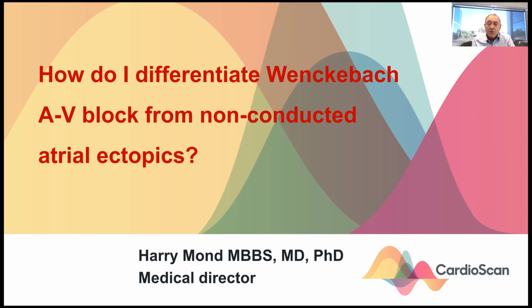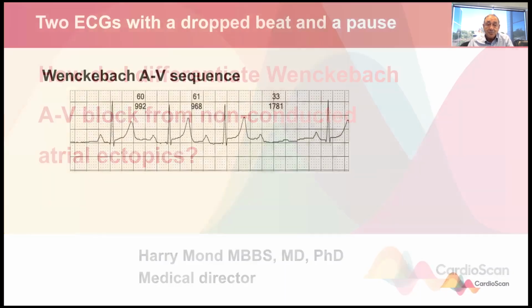So what I'd like to do today is to explain to you the footprints of both Wenckebach AV block and non-conducted atrial ectopics and use those footprints as a means of very rapid differentiation.